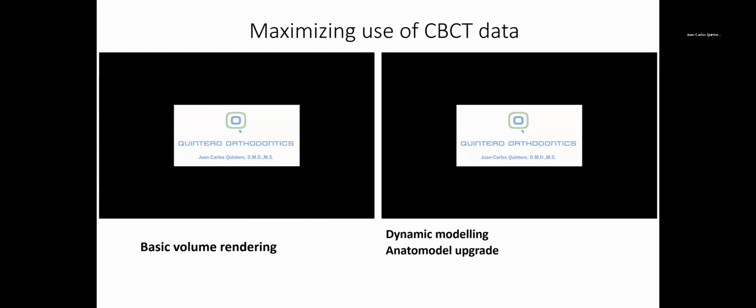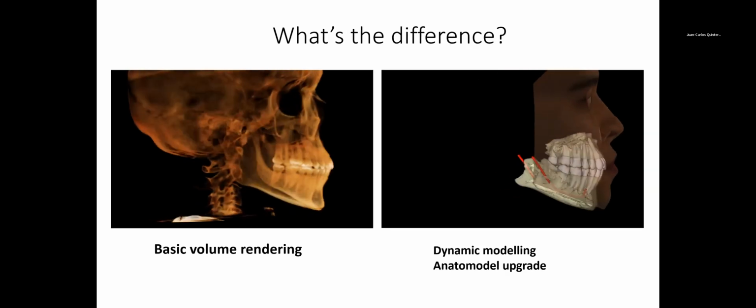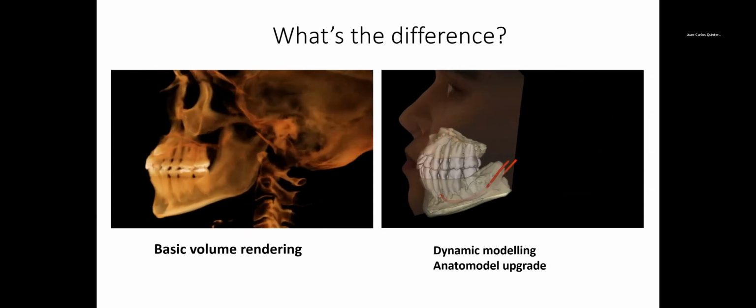In our particular office, and again, we'll have a separate session on the business, how to incorporate the records flow. It takes a little time, it takes a few days to get this back. It gives you an opportunity to think about the case a little clearly, calmly, really set up that treatment conference presentation. Here's another example. Volume rendering, we'll go through this a little faster.